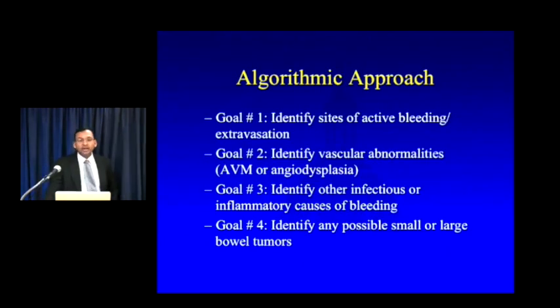Now, once you've got the protocols in place, I think it is critical that you understand how to interpret these studies appropriately. These are not easy studies to look at. There's a lot of information, a lot of potential diagnoses that you have to think about. And if you're not taking an algorithmic approach where you're considering all of the possibilities, I promise you, you're going to miss major diagnoses. So when I'm looking at these studies, I really have 4 steps.